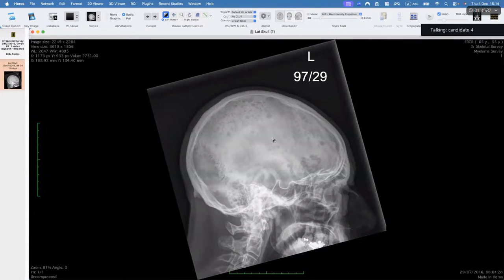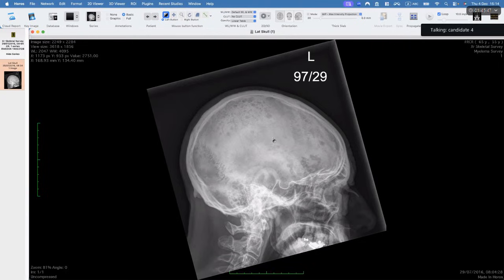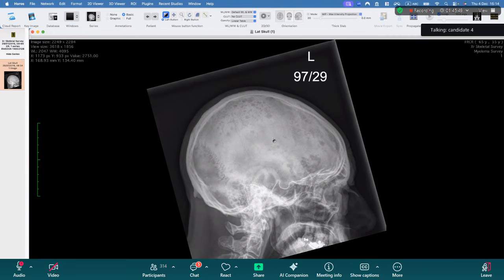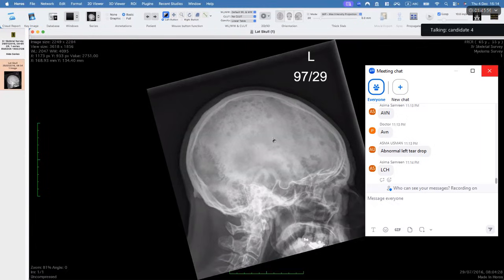Okay, yeah. So, lateral skull radiograph of a skeletally mature patient. I can appreciate multiple variable-sized lytic lesions diffusely spread across the calvarium with some sparing of the occipital region. I cannot appreciate any significant calvarial destruction in this, no soft tissue or scalp swelling.